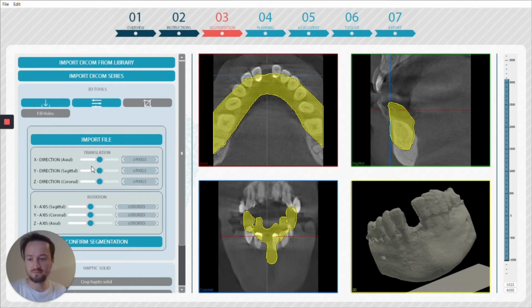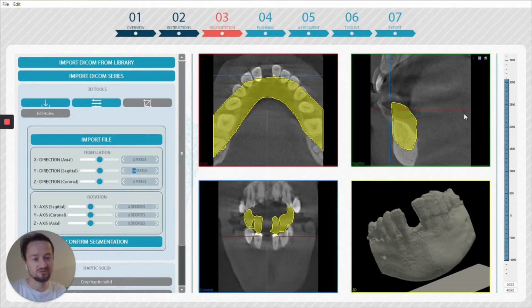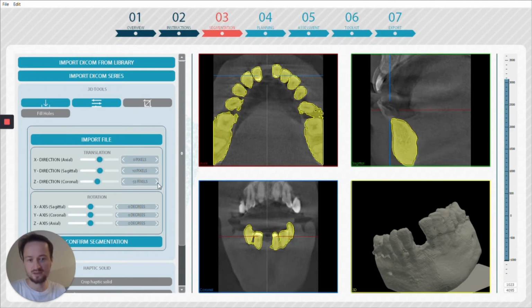So it looks like I change it on the Z axis. So play around with that until it matches close enough. And same with the other views. The axial on top left, just tweak it once or twice to get it in the middle. And then on the X axis, it looks like possibly just 1 or 2 across to match these up, possibly a -2, and then it helps us use the other views to be able to come up with something that matches really well. There we go. So I think that's good enough for now.